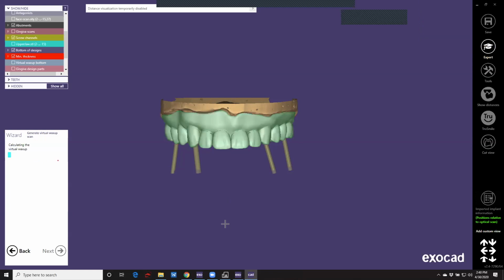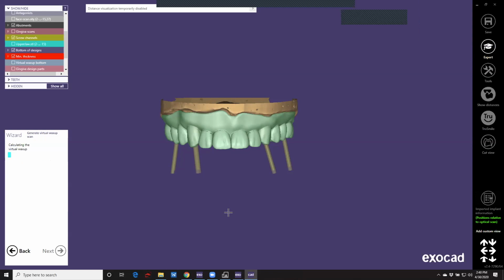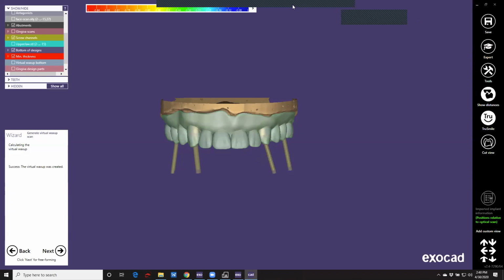Hey Matt, while we're waiting for this to calculate here, does it make sense to have Dave show off? I know there's a couple new features in the upcoming release of ExoPlan on tooth extraction. Is that something that you're prepared to show us real quick? Yeah, that'd be great. I can jump to that really quick. Do I need to stop share? Yeah, if you don't mind, stop sharing your screen, Matt. Okay. And Dave, you can take over there.